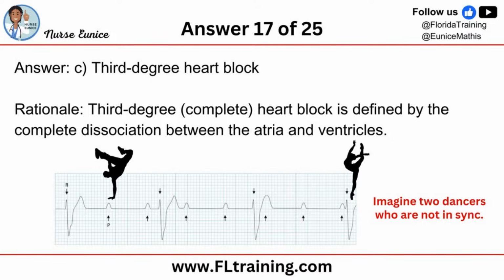If you were to count this person's heart rate, you would not be counting those P waves because those P waves did not produce a contraction. If it produced a contraction, you would see a QRS behind the P wave. So for this one, the ventricles are doing their own thing. They're firing, but they're firing really slow.